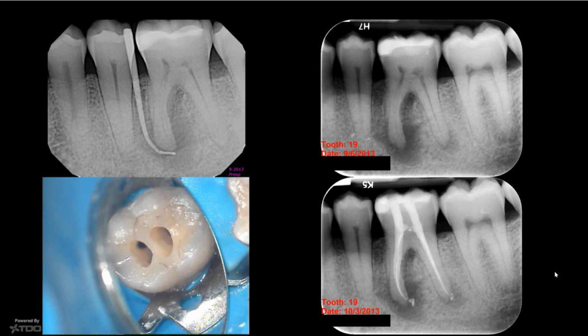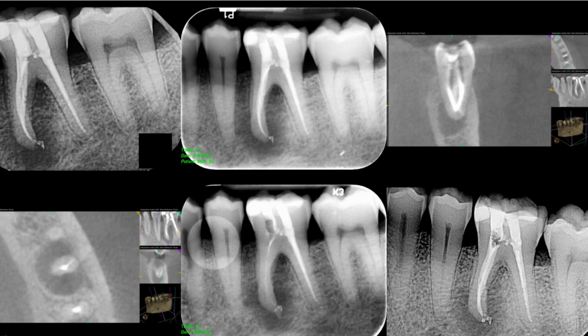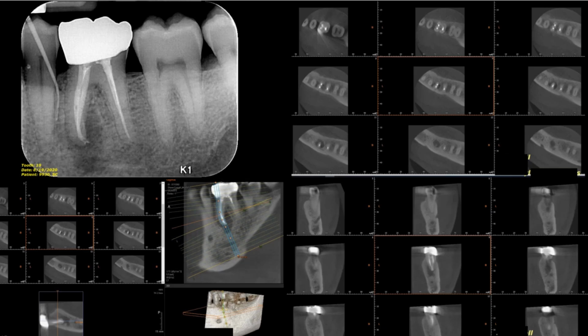There was a sinus tract and a necrotic tooth, and the tooth was treated back in 2013. It wasn't filled until the sinus tract went away, and the case was packed out and everything seemed fine. Three years later, however, at a recall examination, the sinus tract had reappeared and periapical breakdown had apparently happened, and the case was retreated, this time with calcium hydroxide, until the sinus tract went away, and then the case was completed after that.